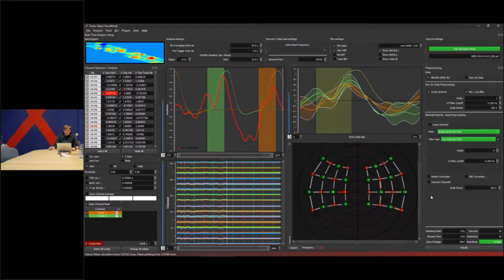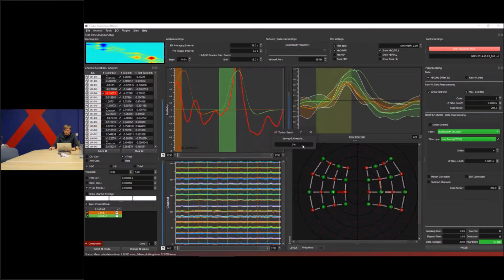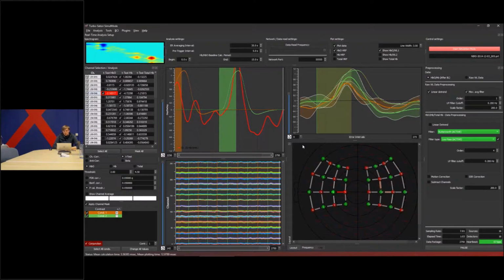you will see that it does a general linear model analysis now. And this GLM is a special one. So during the processing, there is a real-time GLM calculator, which I will explain in the slides at the end. And completely at the end of the run, there will be a full GLM calculator to be sure that the statistics that you see here at the end is really the full statistics, having the full information in there.